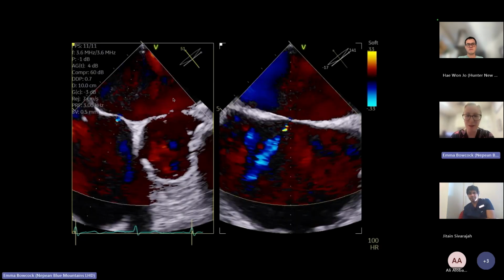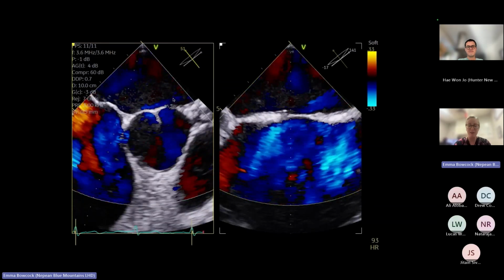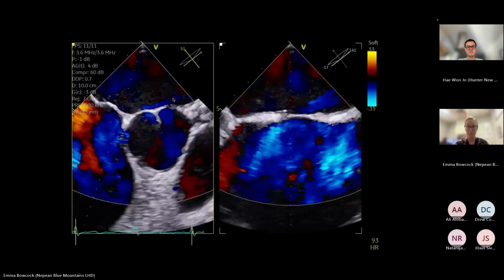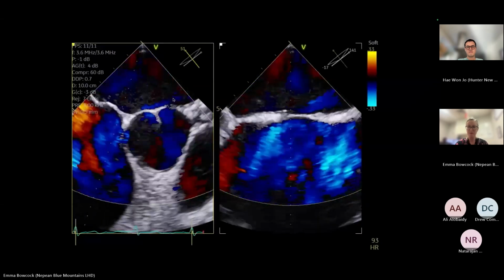You've got a volunteer for this one. It's relatively straightforward. You can all do it as a group if you like. Oh, I haven't looped it, sorry, because I literally just popped this one into the talk. Any volunteers for what this shows?